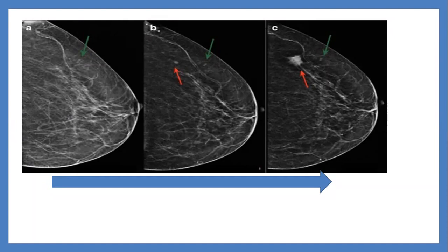Arrowed by? Which arrow? It's a green arrow. Yes, it's increasing in size in the following mammograms. It's increasing in size and density. And there is an associated... It doesn't look significantly increased, more or less stable. Maybe, I don't know, but to me, I've seen it from near here, it looks unstable. Okay.